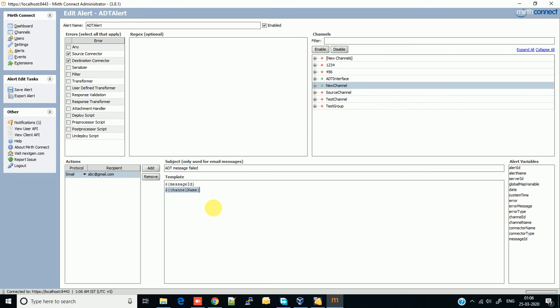So it depends upon you what you want to send, but always send a message in such a way that in the mailbox itself it can be identified which message type this message belongs to, or why it failed. So configure that template in such a way that you can send the error message also. Okay, so as you can see, every configuration is done. There is nothing much left, and it is quite simple also.